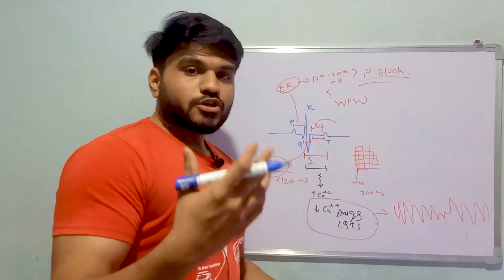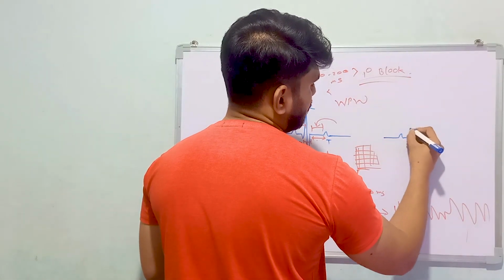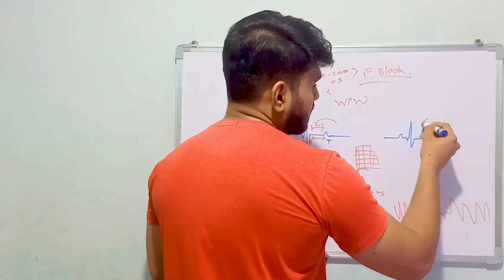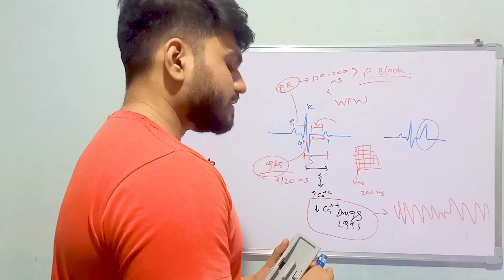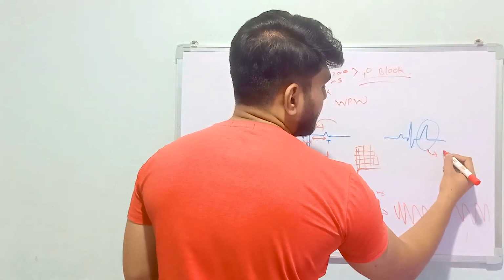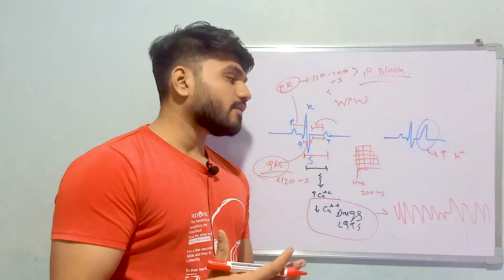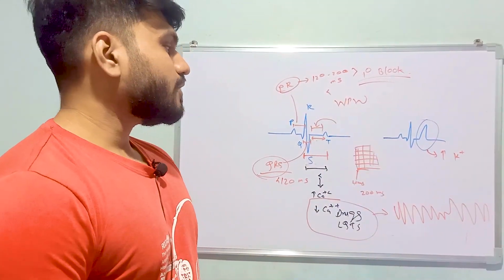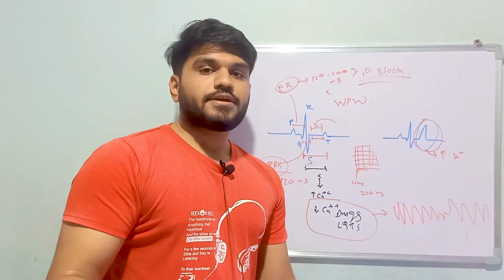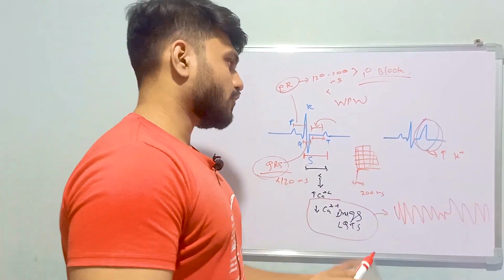Okay, so this is the typical ECG of torsades de pointes. So let me compare it with the normal waves. This is our P wave, this is our QRS, and this is our T wave. So this is not a normal looking T wave. This is a peaked T wave, and this you can see in hyperkalemia. When you have high potassium level in your body, you can have the peaked T wave. And what other thing will this peaked T wave represent? This will represent hyperacute ischemia in your heart. That ischemia is going on in your heart right now.